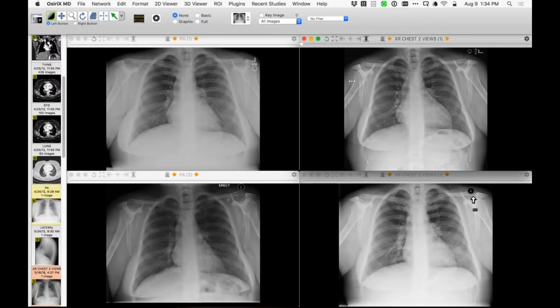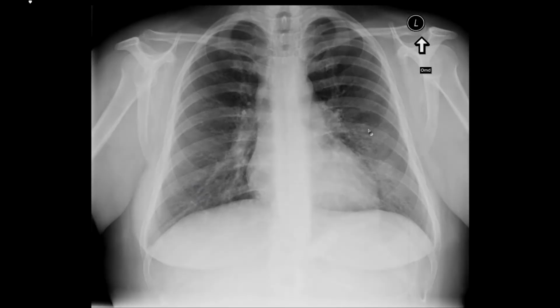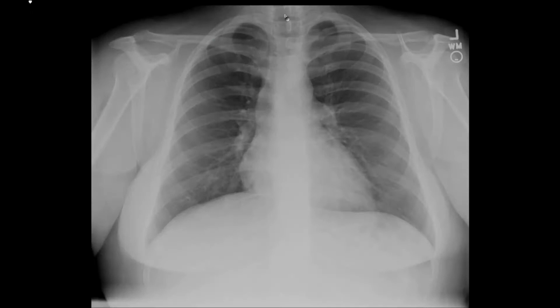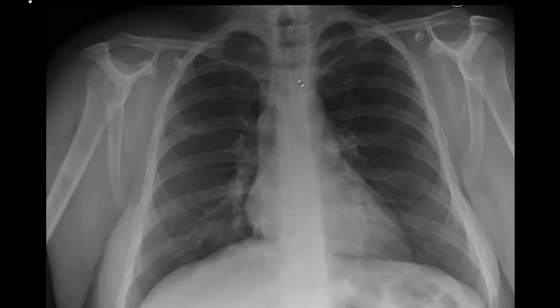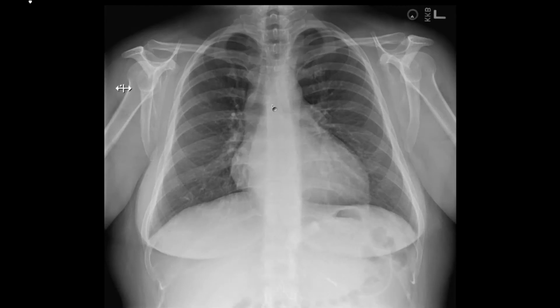And then I'm going to give you the next one, in which one of the findings is still there. So I'm going to go back now and just quickly show you the finding on each one of them. So the finding here is up here, where next to the trachea, there's air. Next one, back in this time, same thing right up here, next to the trachea, there's an air-containing structure right here. And then on this one, in addition to air right here, there's also this, which is this abnormal interface in the azygoesophageal recess, like that.